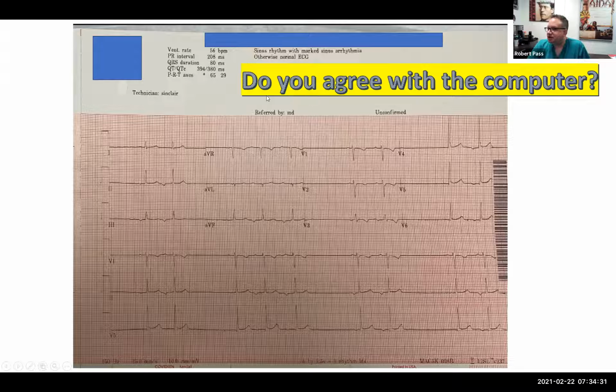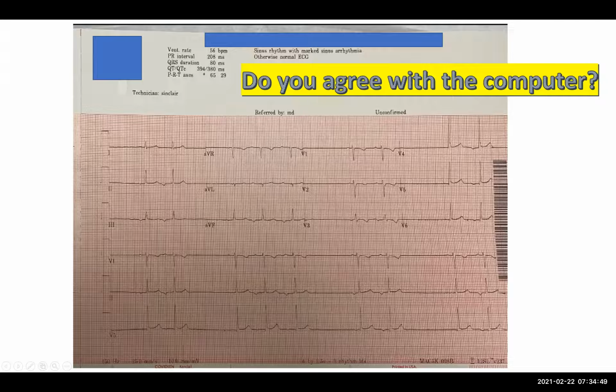So this is not sinus arrhythmia. And I've often explained to you guys that grouped beating, you should think about Wenckebach, but that is not what's happening here. So all group beating is not Wenckebach, but it should be in your differential. Now we know that ectopic atrial rhythms are also causes of group beating as well. So, okay.